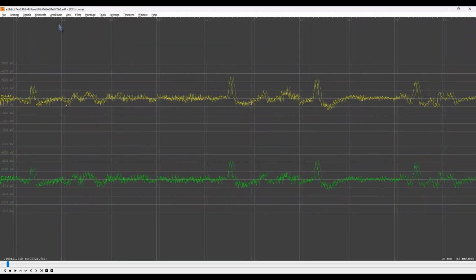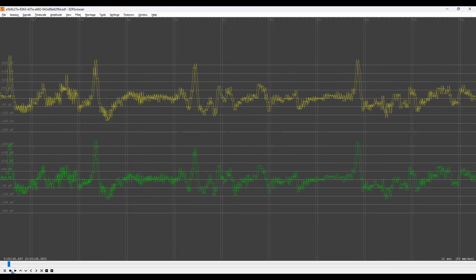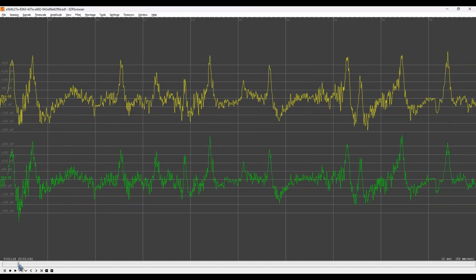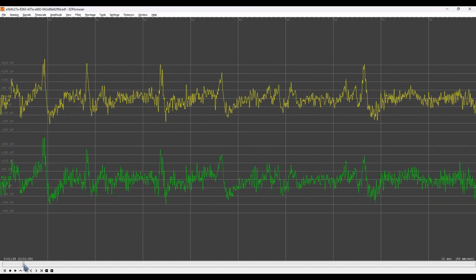So here we can see it was just a 2-channel protocol, FP1, FP2. They're already pre-highlighted, so we're just going to click Add, and then we're going to click Add Signals. And there's our 2 signals. So then at the bottom, you've got, it's kind of like a movie player. You can just click play. That's going to start running it back.